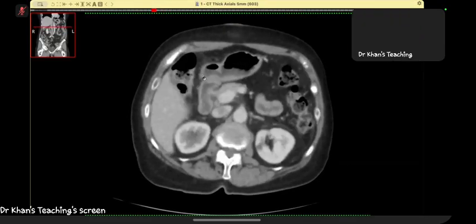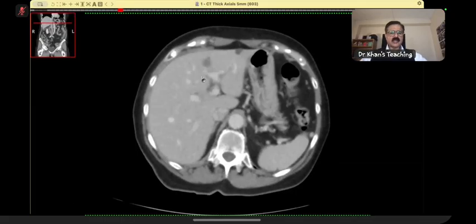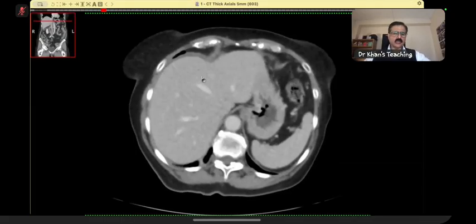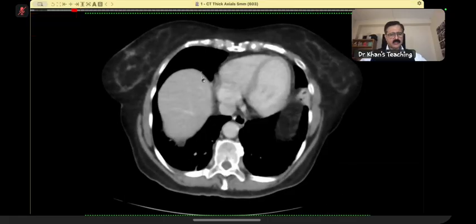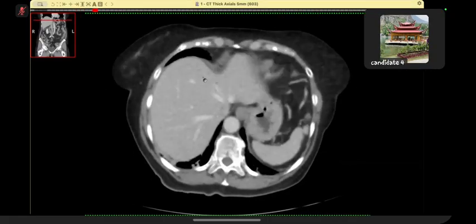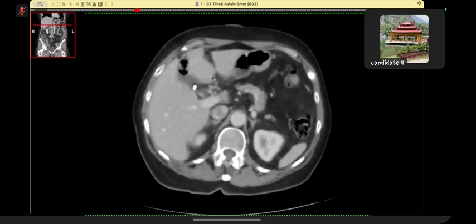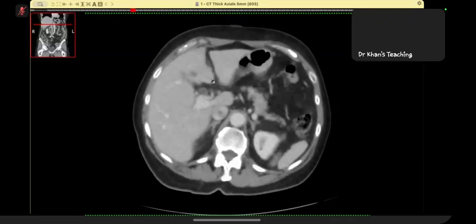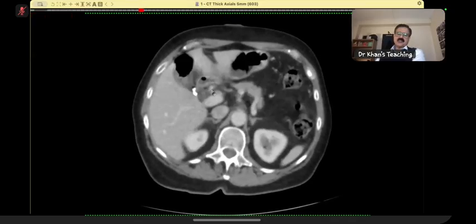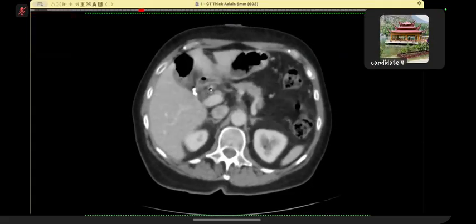This was in the colon, so don't worry. The colon has actually gone into the gallbladder fossa, so it is all colon. Okay, sir. So there is most probably no free air. The more concerning findings are these multiple well-defined hypodense areas, which are small cysts, and these were known. Don't worry about it.